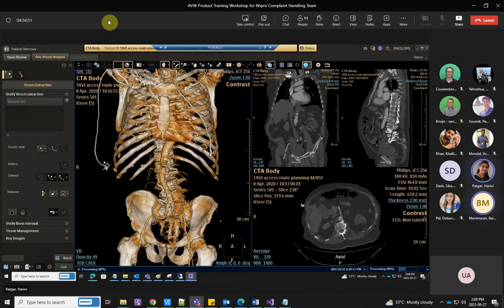The same applies to skull study also. Once we load a CT head case, this does. And I will not load and show you the MR, but for MR, the difference is, here we have a processing of this bone and muscle separation, no? But in MR, it directly loads. We don't have any processing there because it's a normal soft tissue scan, and we don't have a volume image over there. Here we have volume and all, where the processing or segmentation comes in picture.